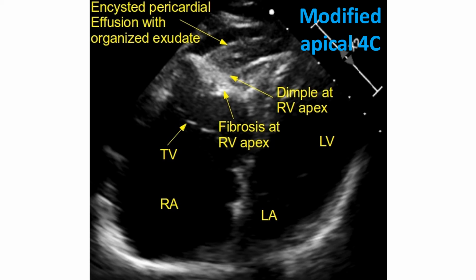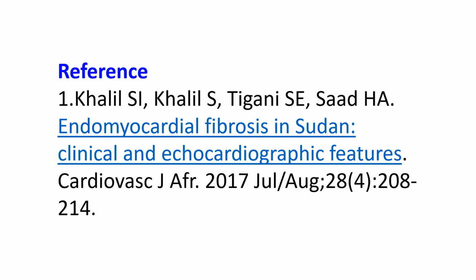As the prevalence of EMF is coming down drastically in our region, such images are rarely seen in an echocardiographic laboratory. Khalil Esai and colleagues have recently published data on 23 cases from Sudan, which constituted 0.5% of the 4,332 echocardiograms at 4 hospitals.